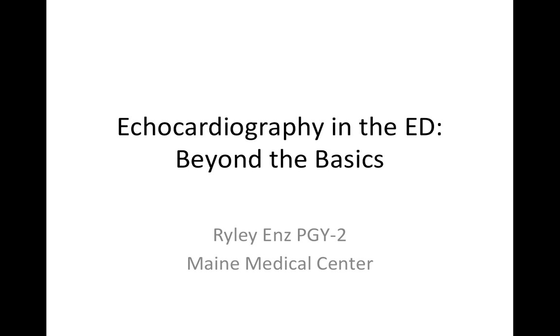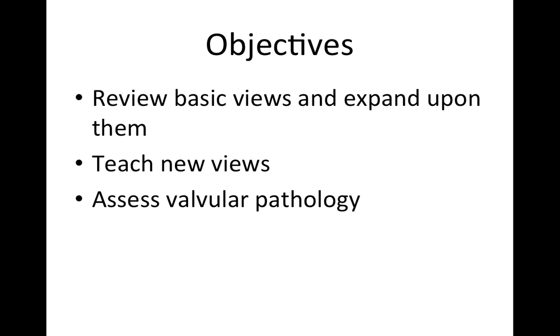I wanted to discuss echocardiography. This presentation will cover the basic views of echocardiography in the emergency department, but also go beyond those basic views to discuss more in-depth principles. The goals of this video are to review the basic views and expand upon them, to teach new views, and to also assess valvular pathology. There are 3 divisions in this video with titled slides, so those of you already familiar with the basic views might want to skip ahead to the portion where we discuss new views in valvular pathology.